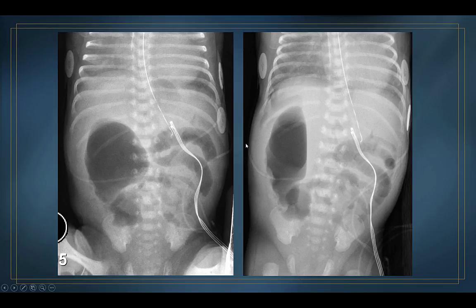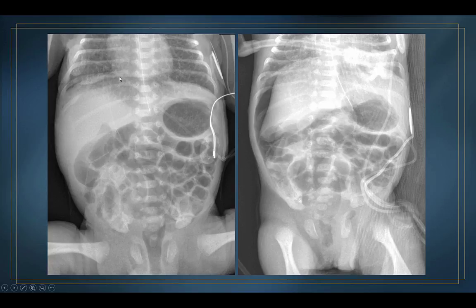That's tough to say, but the decubitus shows the free air the best. And he obviously has a very abnormal loop of bowel with a large air fluid level within it. This is another patient with the cupula sign. But it's clear here that you have lucency extending over most of the right lobe of the liver. So it shouldn't be confused, but this is the most important thing to look for.